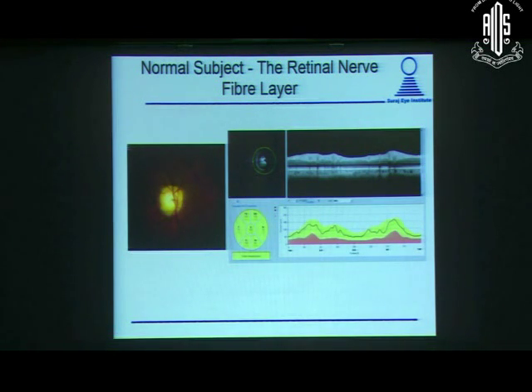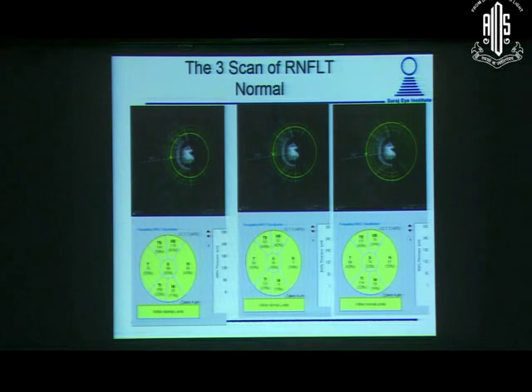And you can see a small line that's going from the center of the optic disc to the fovea. So that would align the fovea with the optic disc center. And so that would help to take care of torsional elements to some extent, so that you may get slightly more accurate retinal nerve fiber layer readings when you're assessing the retinal nerve fiber layer with the OCT.